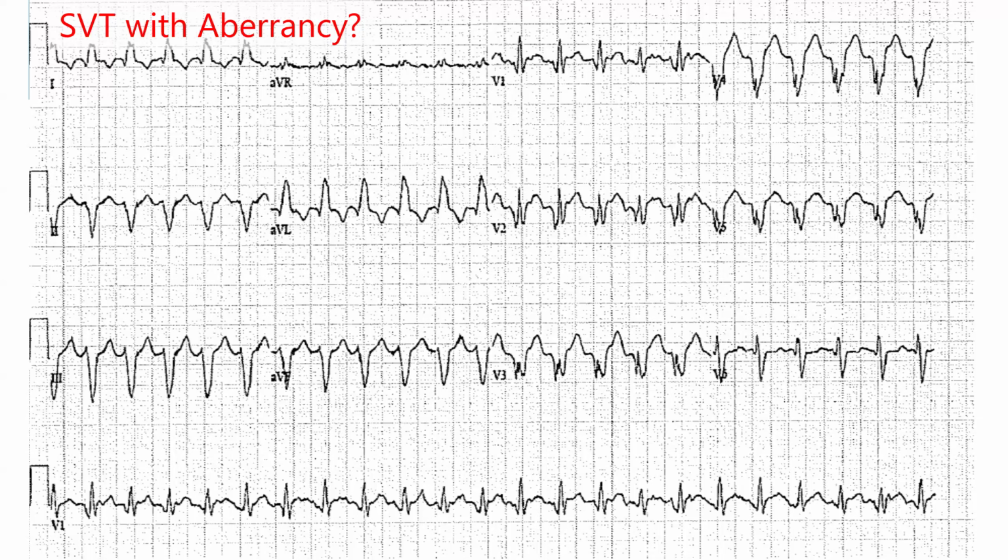You can have that. This person does have a documented history of atrial fibrillation, so it's altogether possible that this person has a flutter. This person has not undergone an ablation procedure, and I mention that just because it's often the case that you'll see these atypical flutters without any clear atrial electrical pattern in people who have undergone an ablation of some type in the past, where there's enough scarring and enough structural change in the atrium such that atrial activity can be masked or not clearly visible on the surface ECG.